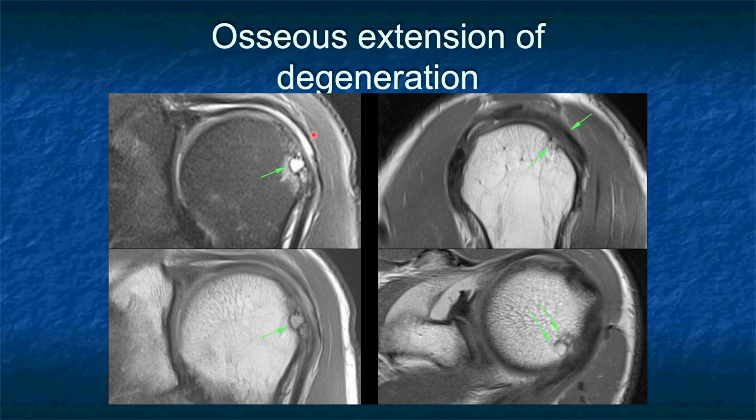In some situations, you can see tendinosis, that intersubstantial degeneration of the tendon, instead of just staying in the tendon, may track into the bone. Remember, the tendon and the bone don't sort of stick on each other with Fevicol. They interdigitate with each other. So that tendinosis, that degenerative change within the tendon can dissect into bone and form a cyst. And that cyst that forms can be clear. And sometimes that cyst, if it forms relatively quickly, will produce bone marrow edema around it. And if it forms slowly, may produce no bone marrow edema around it. So that's normal to see.